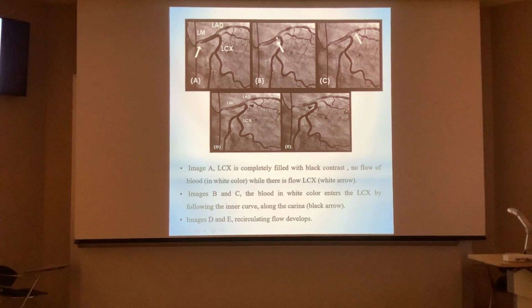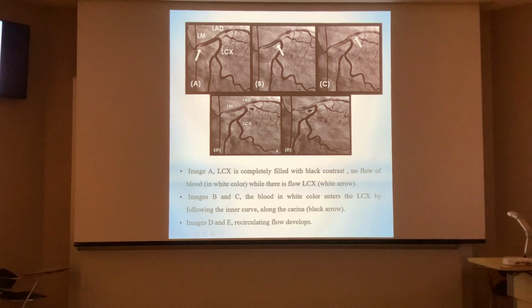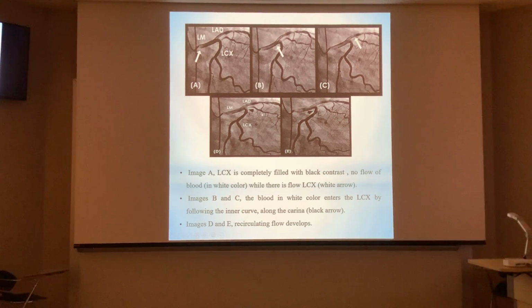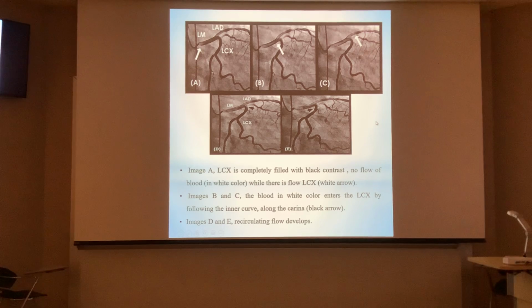the division of the left main and ostium. In images D and E, we see very clearly the recirculating flow is formed at the ostium.